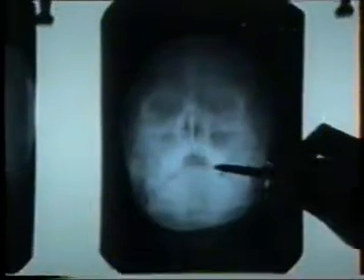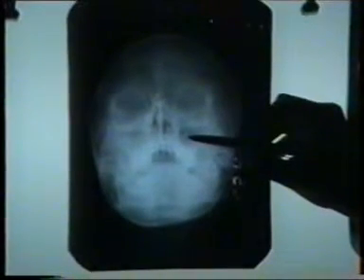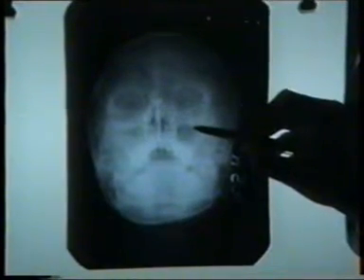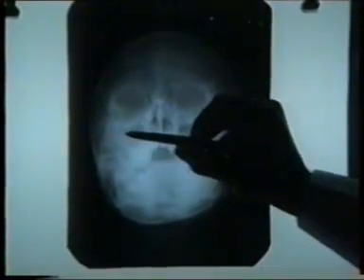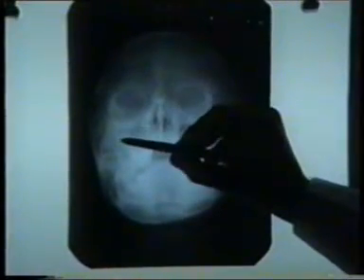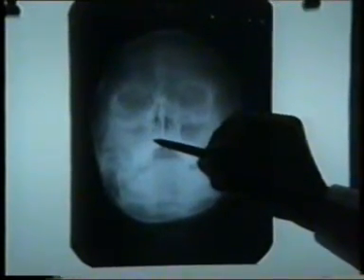The next plate shows the patient having an open mouth, with a radiolucent shadow, which is the sphenoid sinus, and in the maxillary sinus, we have a small opening which is marked by an arrow. I think you may be able to see it. It's the infraorbital foramen. On the right maxillary sinus, we see two radiopaque shadows with convexity pointing upwards, meaning the central point is highest as compared to the periphery, exactly unlike a fluid level. So this is a right-sided, bilateral or multiple maxillary polyp.